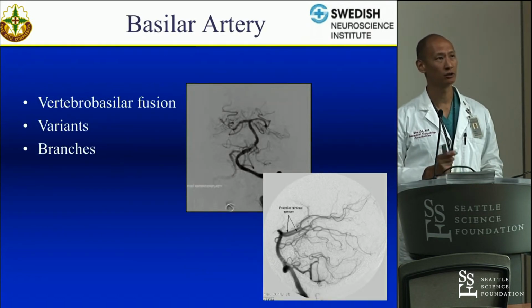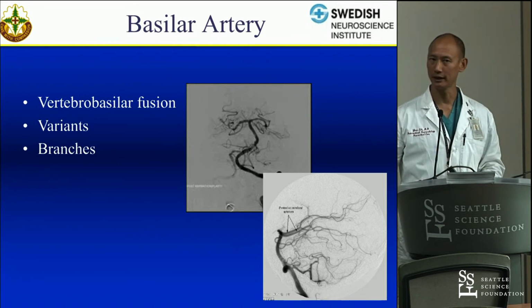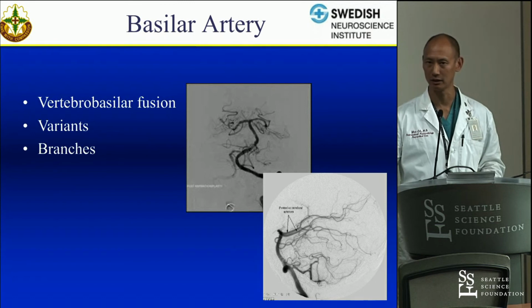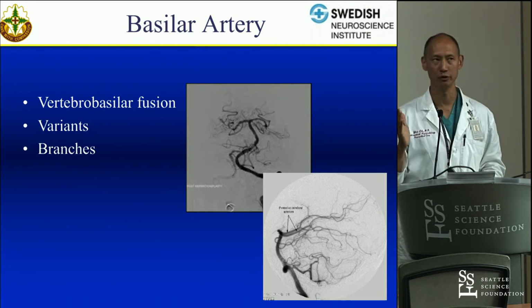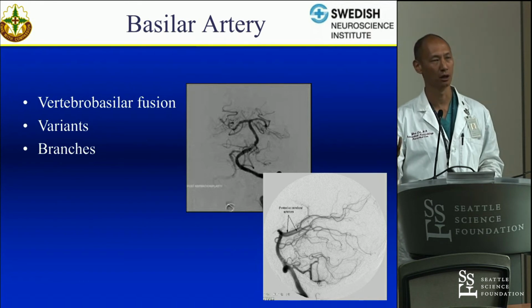And as Shane also mentioned, the AICA and PICA really go together. About 1 in 4 people will have a PICA that supplies both the inferior cerebellum as well as the lateral cerebellum, and that's termed a PICA-AICA complex. Usually the more frontal or transfrontal the view you get, looking at the parenchymal phase is the best way to identify how much of the cerebellum each of the AICA or PICA is supplying.